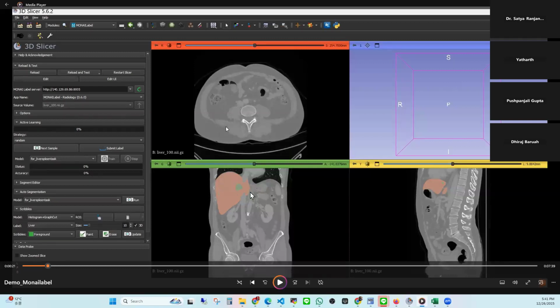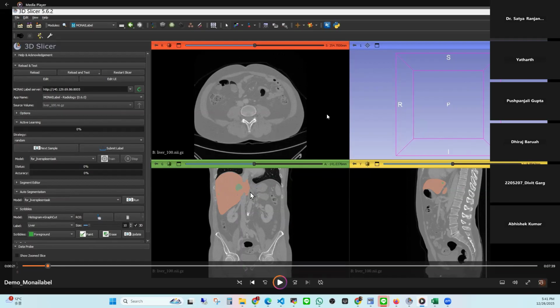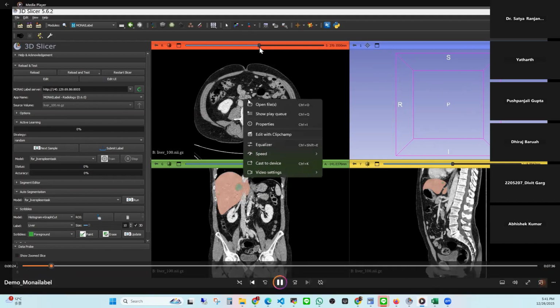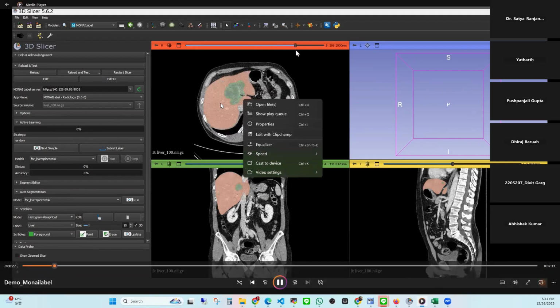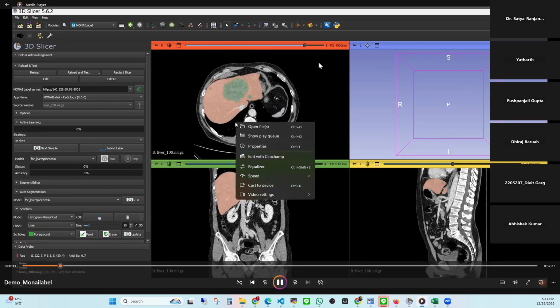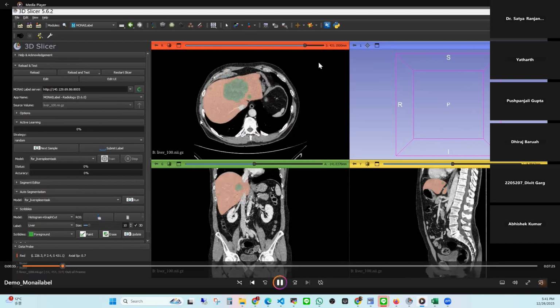When you upload a liver image, you need to upload the abdomen CT. This is the axial plane, this is sagittal, this is coronal. So we have different planes for the image. And then we view the image. Instead of only looking at the image, it doesn't look proper, it's not clean. So we can convert this to the abdomen window, and then we can view the labels properly in this way. And how exactly these things are done, like the annotation is made, I'll show one by one.